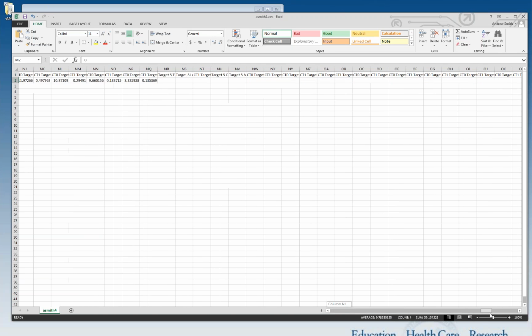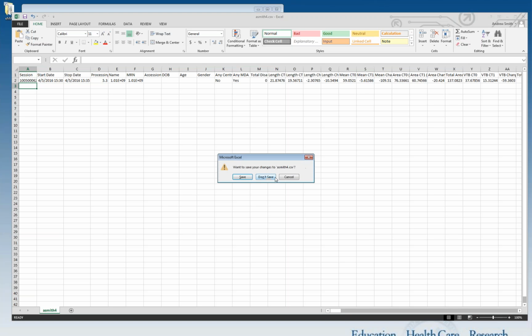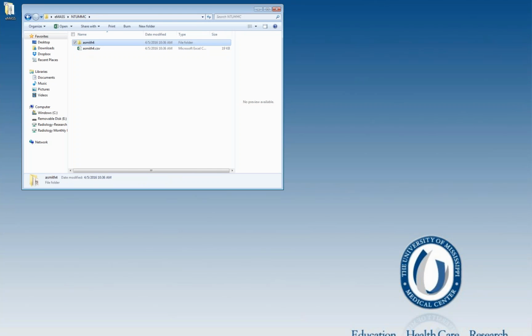Tons of metrics that we're keeping track of. All this is auditable. If we make new measurements on this patient for some reason, it's going to get added in as a new line. You're going to be able to track every movement that you make with this software, and that's critical in these clinical trials. So we have a very large, rich database.